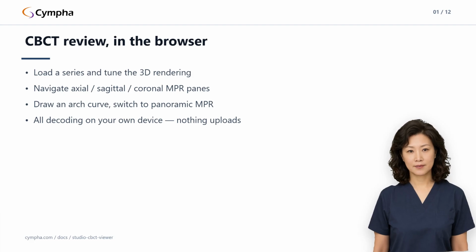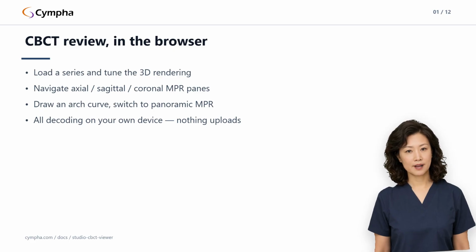One point worth stating up front, because it surprises people: the entire decode runs in your browser tab, on your own device. Nothing is uploaded to a server, and no account or sign-in is needed. CBCT review in Studio is fully open.